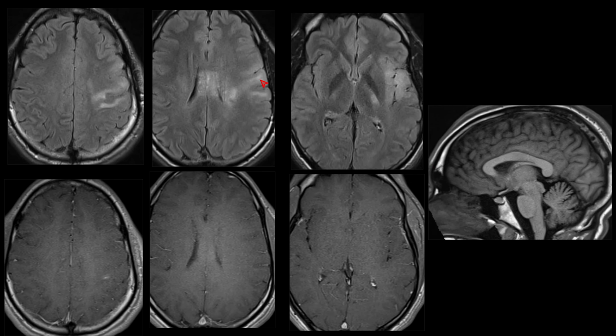Here you can see you have hyperintensity involving the frontoparietal lobes, and it appears to have a propensity for extension along white matter, where you would expect the corticospinal tract to be going along the internal capsule, with some hyperintensity involving the insula as well as the anterior temporal lobe, and some of the hyperintensity also extending across the corpus callosum.